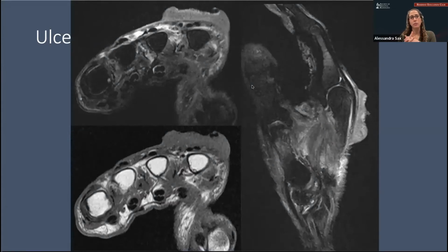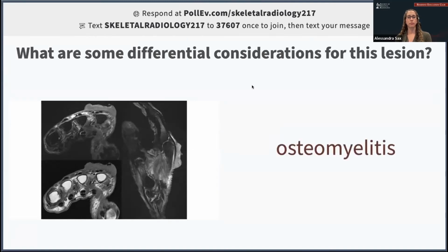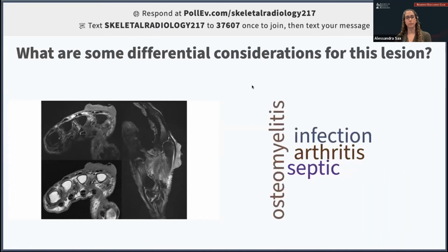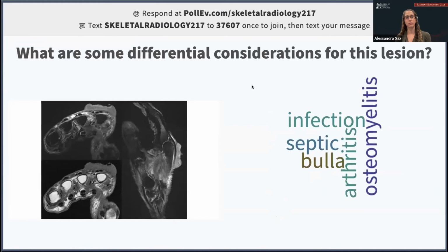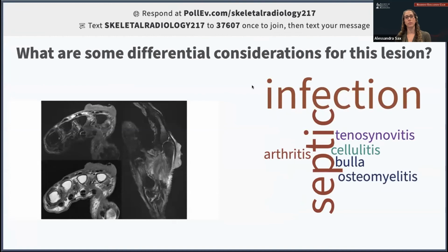All right, let's take a look at these images. All right, what are some of your differentials for this? Yeah, this is a tricky one.